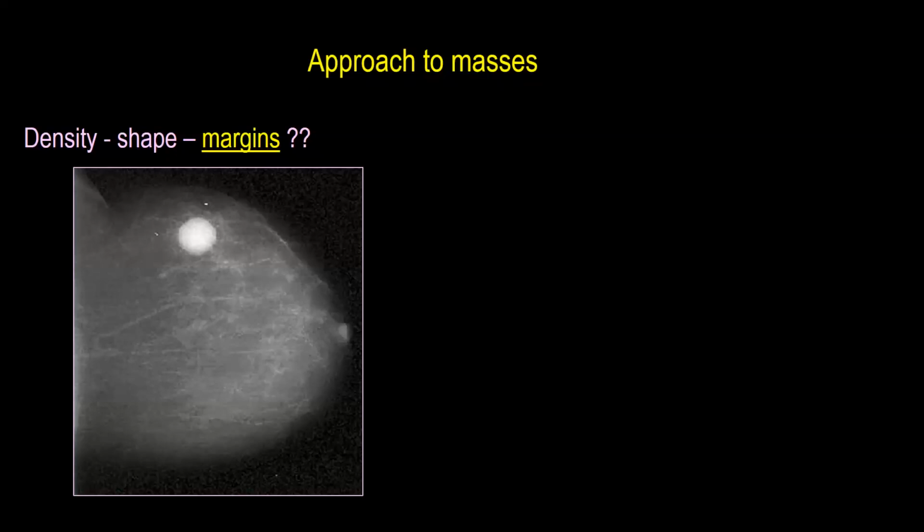High density, okay, but it is circumscribed; still, being high density, we'll give it BIRADS 4C. From the start, we'll go for ultrasound. Unless ultrasound demonstrates a simple cyst, it will be suspicious. By mammography, this lesion is BIRADS 4C.